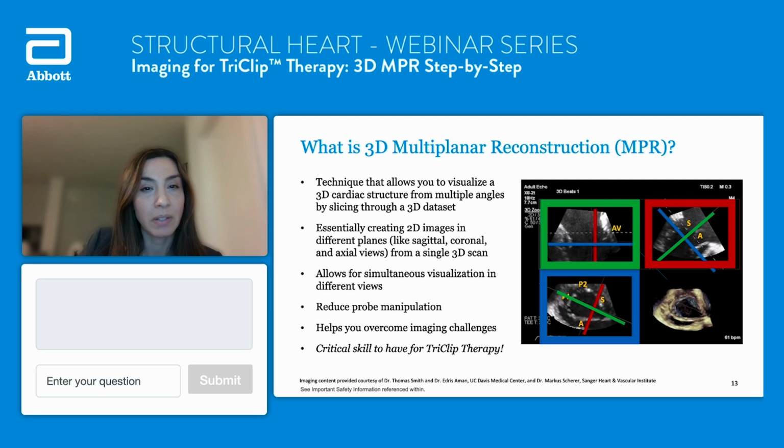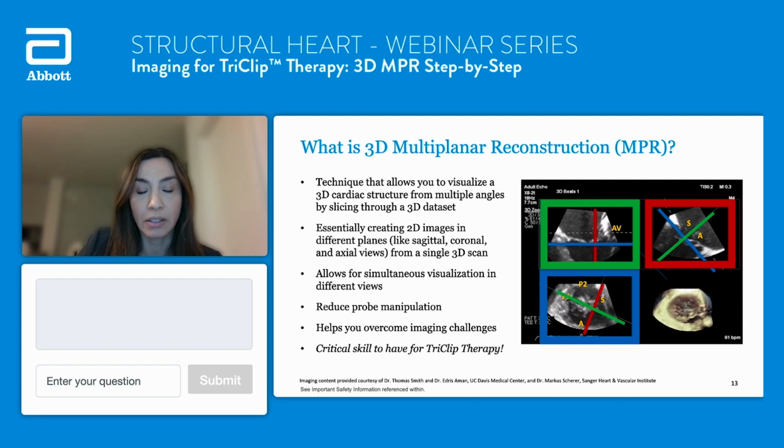And so what is 3D MPR? Well, it's a technique that allows you to visualize the 3D structures inside of the heart using a 3D volume set. If you think of it, it's almost like imaging a cardiac structure on the sagittal, coronal, and axial views. So you're able to really get a three-dimensional view of that particular structure all in one image. Oftentimes we like to display it in this 4-box configuration here, and we're going to go through it and hopefully answer any potential questions that you may have.